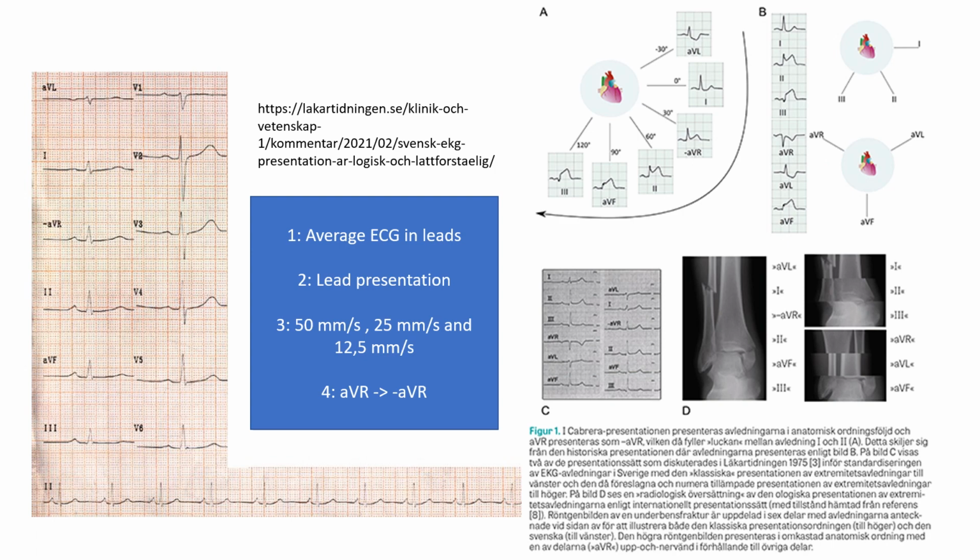It's somewhat logical, in an alphabetic kind of way, but it's not logical from an electrophysiological standpoint. And that's the greatness of the Cabrera, I think. You see the heart just like you see the precordial leads from 1 to 6, then you see the other leads from above to below, right? Which is not what you see here at all.